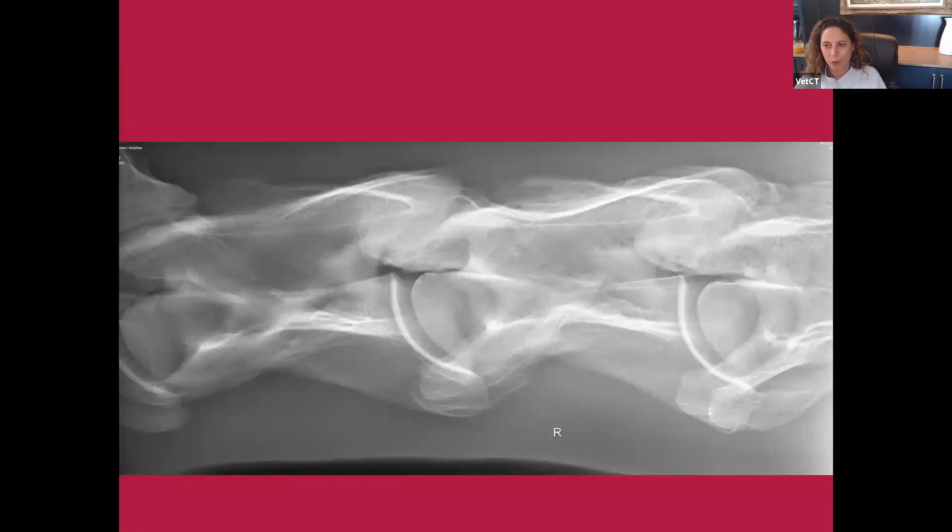I am super careful, sort of anal retentive, when I make these, because oftentimes I feel like there are big decisions on the line. So I will show you how that applies to radiographs. I measure the height of the vertebral body. I try to make the line perpendicular to the floor of the vertebral canal. Then for my intravertebral sagittal diameter, I choose the narrowest point along the vertebral canal, measure that perpendicular height, and create that ratio.